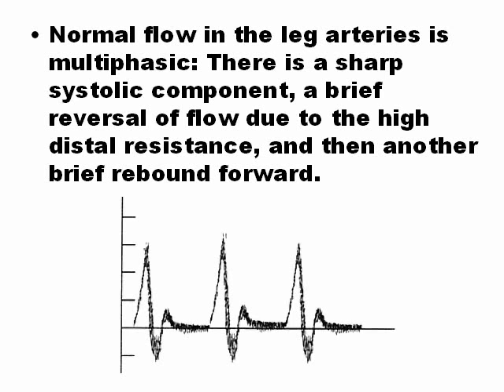But in the leg arteries and also in the arm arteries, the flow is multiphasic. This is called triphasic flow. At the beginning it's positive. When the systole finishes, it becomes negative. This is because blood flow comes back and after some time goes forward. This is triphasic flow. This is how the arterial wave of the arteries of the leg looks.